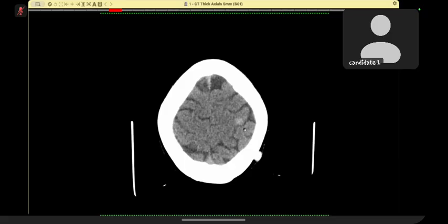So this is a cortical hyperdensity in the left high frontal region, and there is no surrounding edema noted. There's no vasogenic edema seen. There is no history of trauma, so this won't be a contusion. This could represent a hemorrhagic met, but there is no surrounding vasogenic edema, so I'll rule that out also.